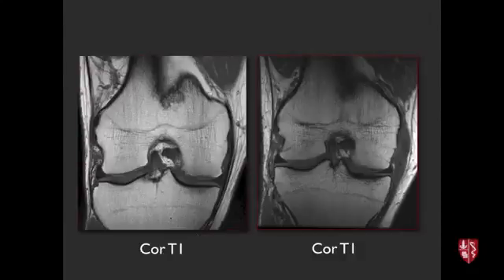Okay, so quiz mode. Coronal image of the knee, right? So a front view. I'll give you this. This is lateral and this is medial. So this one is normal. So the question is, what is this structure here in a mid-coronal image that's abnormal on this image? Different patients.